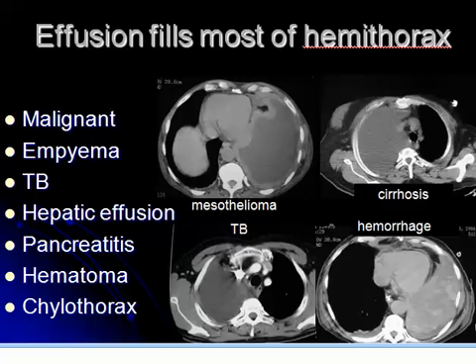Effusion filling most of the hemithorax, with thickening. You should exclude malignancy, whether primary as mesothelioma or secondary. You should exclude empyema due to infection, for example TB. You should exclude the presence of hepatic disease or pancreatitis. Of course, history of trauma should be searched for, as sometimes hemorrhage may cause massive effusion.